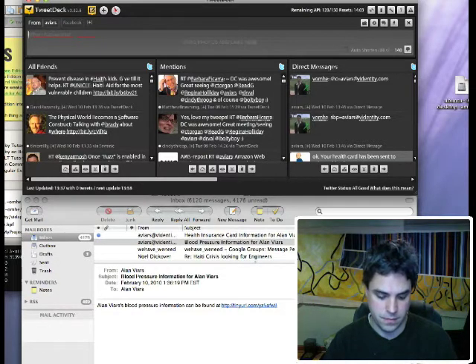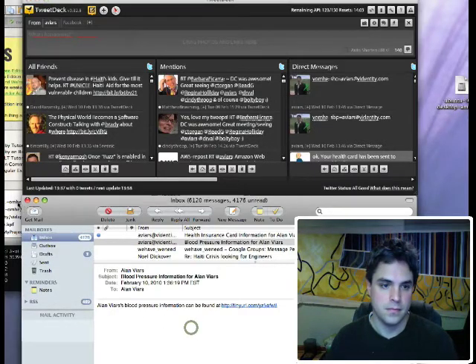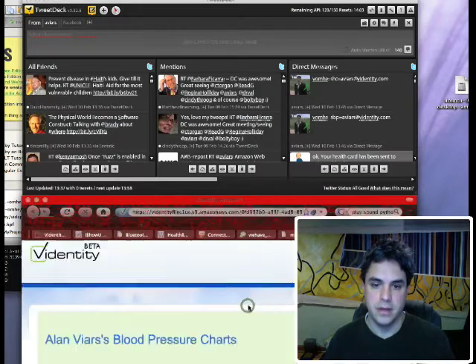There we go. And here is my blood pressure information.